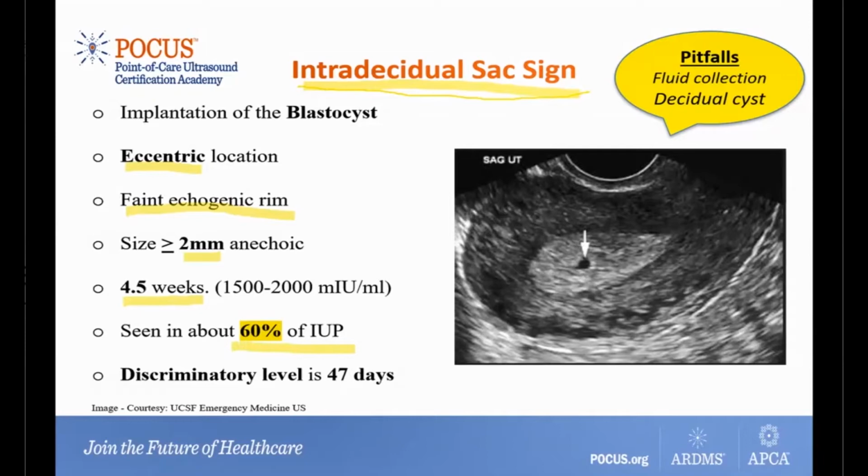The discriminatory level is 47 days, but also be aware that it could very well be a fluid collection. It could just be a fluid collection in there, or it could be one of the pitfalls. It could be a decidual cyst.